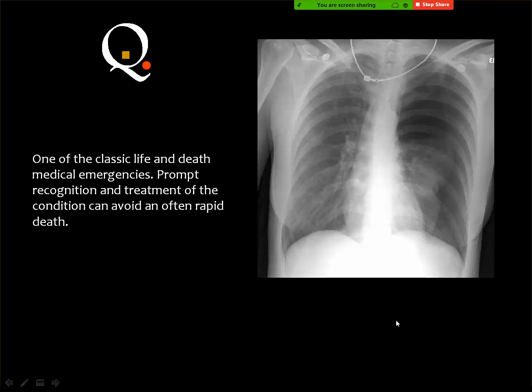Pneumothorax on the left side. Yes, a simple or tension. Simple pneumothorax. How can you differentiate between both? It is pushing of the diaphragm. Now the diaphragm is not depressed, the deep sulcus sign is not there. And the mediastinum is more or less central.